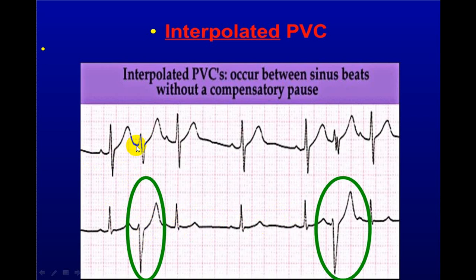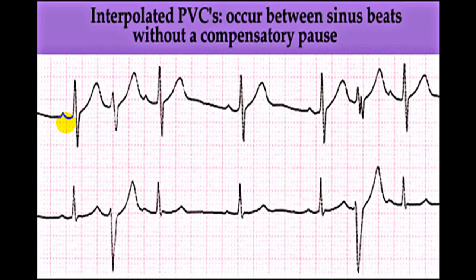But otherwise, on a plain simple ECG, you can say interpolated VPBs. But when you take the pulse without comparing with the apex, you will find that the pulse is regular. This is characteristic of an interpolated ventricular premature beat. This is again a diagram showing you the same thing, an interpolated ventricular premature beat.